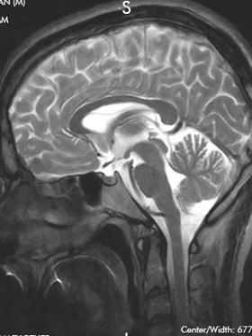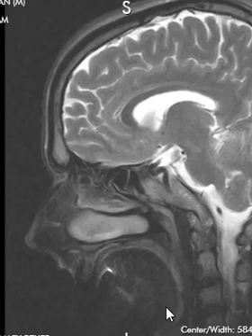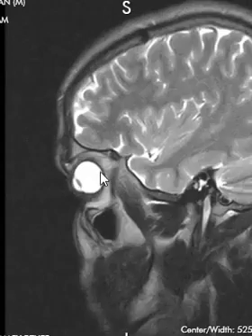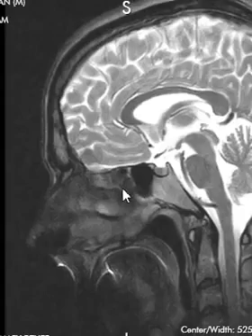So I'm going to start with this view. It's called a sagittal image. If we scoot the patient over, we can see that the nose is off on the left-hand side over here, and we can see the tongue is down over here. The sinuses are right here in the middle, and the forehead is right over here. This area is the frontal bone, which is the forehead. Now if we roll towards the right-hand side, we can see the right eye. This round area here, you can see the lens in front, and we see the left eye over here.